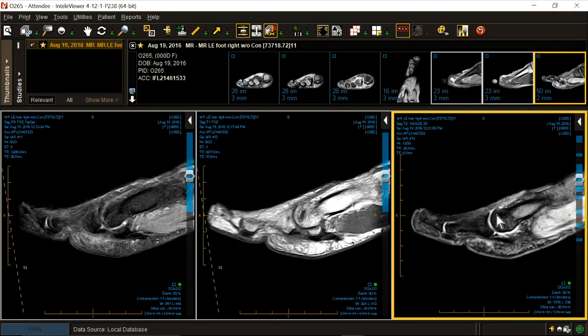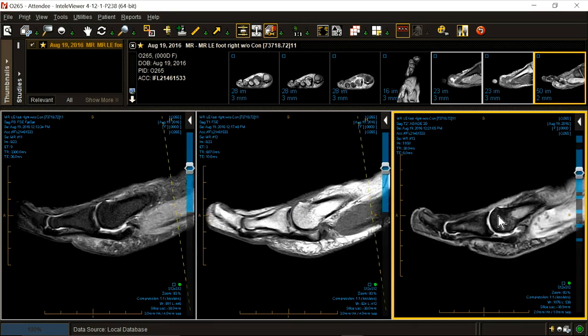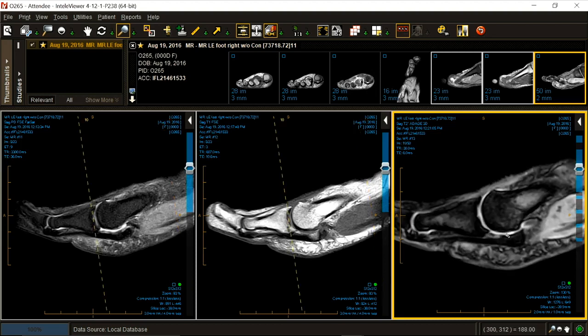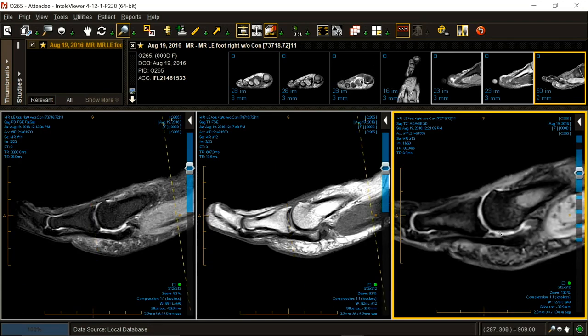Let's take a look. Now, it's not uncommon to see areas of attritional tear, what I would call wear and tear variability in the thickness of the plate. So I'm not disturbed by this. I'm not disturbed by this because my plate is straight.